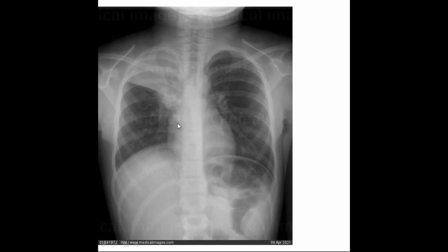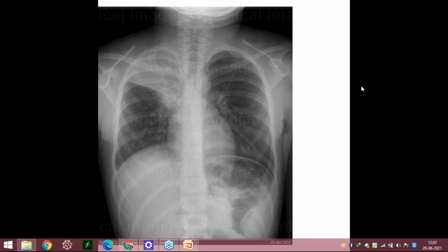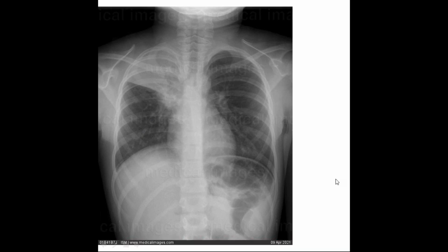Yeah, don't go to the hydatid cyst. Again, Rahul, don't jump to the diagnosis. Right lower zone is fine. What is the issue? We are talking about the previous X-ray, as one of you pointed out that there is some problem in the right lower zone. Right lower zone is fine. Right lower zone, what is the issue? Pushkar. Yes. Okay.